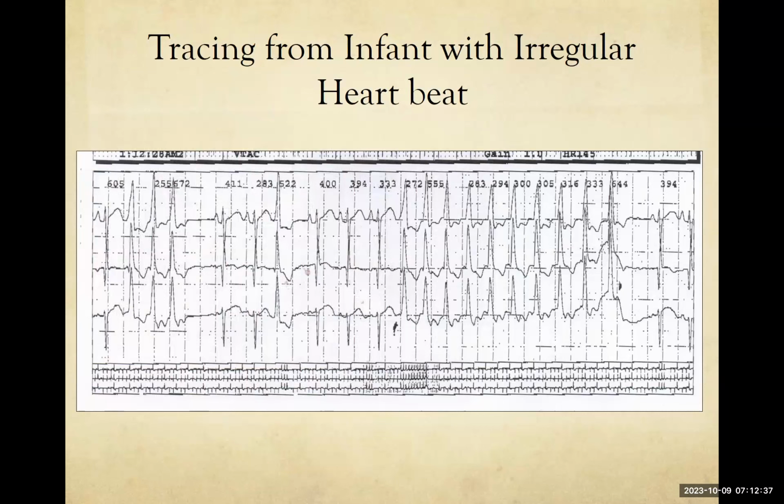So this is a tracing from an infant who was identified to have an irregular heartbeat in the well baby nursery and was brought to the neonatal ICU, and this is the rhythm that is observed. So why don't we go to Dr. Kalis and see what she thinks we're looking at here.